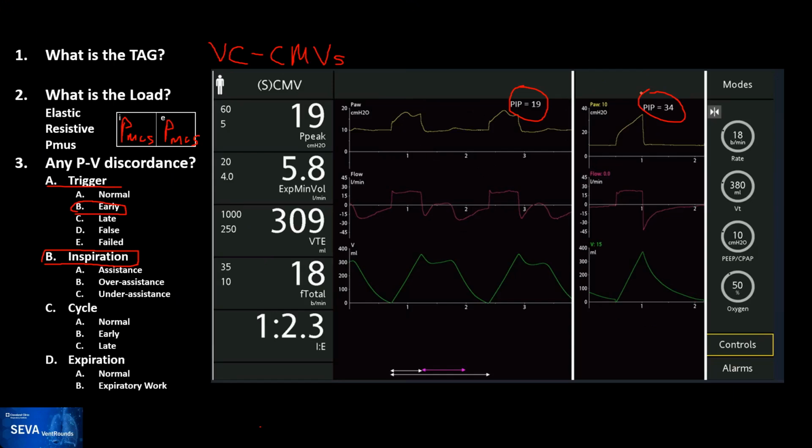So in this case, we see work shifting, but it's not severe because the airway pressure isn't dropped below baseline, and it's not even halfway. So I would say that's probably an acceptable level of assistance at this point. Would you agree, Ari? Yes, and concerning what you say, maybe the respiratory rate is playing a role here in a possible over assistance. There you go. It depends on the clinical scenario, right? Yes.